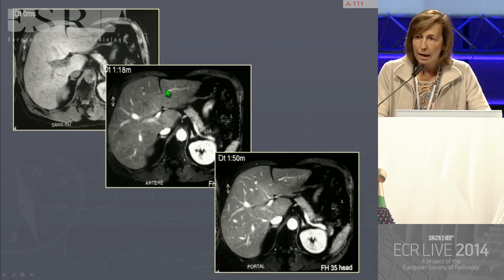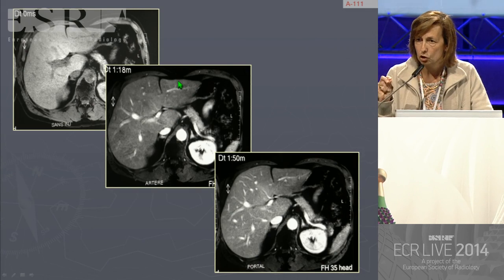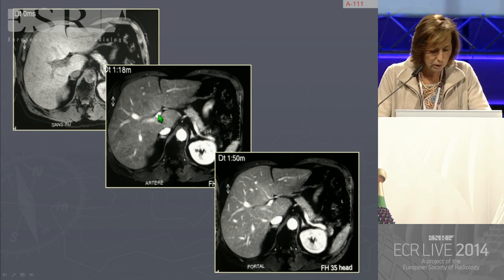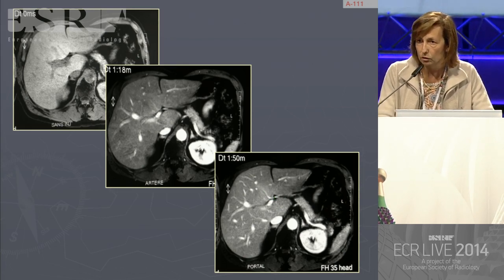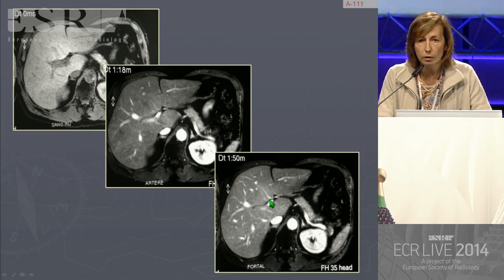Okay. Now if we move to the contrast-enhanced MR sequences, what do we see? And we have always to pay attention to these very small vessels. We see a vessel in a situation we usually do not see vessel. We see a small vessel here entering directly the segment 4. You know the liver vessel anatomy. This is not possible except in patients with abnormal variant of the portal veins. And we can be sure that this vessel is a vein because it enhances on the portal venous phase.